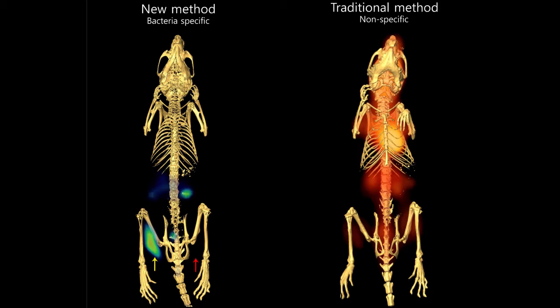But the old method is non-specific, and it cannot distinguish the live bacteria, which is the yellow arrow, from the dead bacteria, which are causing inflammation, but then no live bacteria there, which is the red arrow on the other side.